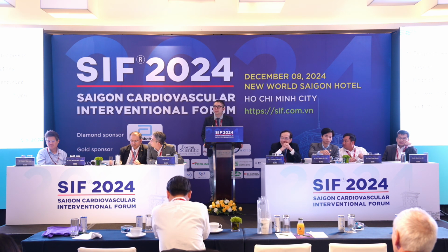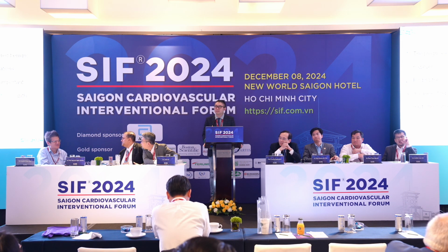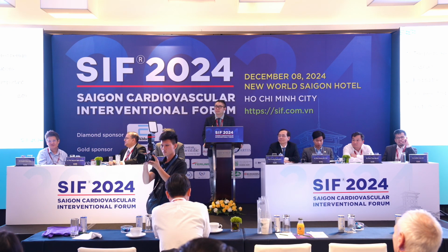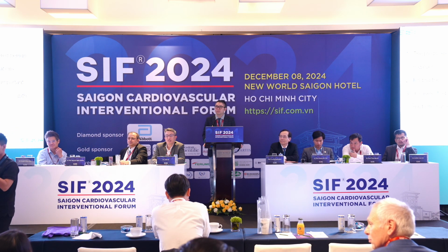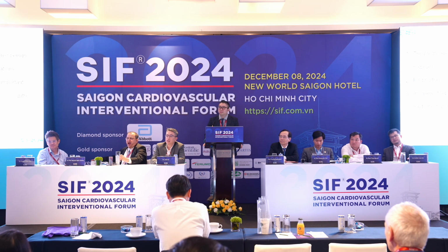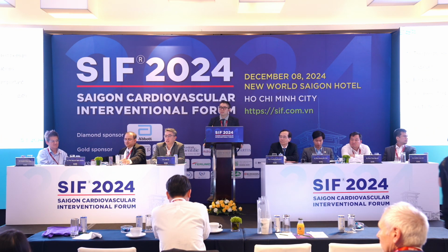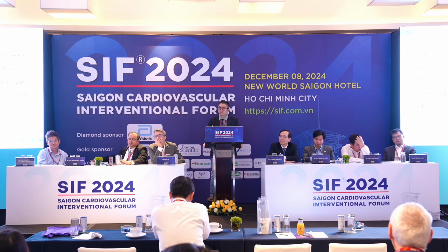I would like to congratulate you on your two very interesting cases. But for the second case, I have a comment: because the patient had a cardiac arrest, you have to check your angiogram again. Without any reason, you have to check the angiogram. I think you can check for two reasons. You should check whether any artery perforation is still there or not. And what about the thrombus, after you had very slow flow after the case? I think the patient is quite lucky. He overcame the cardiac arrest. But I think there is a chance when we check the coronary angiogram again after the cardiac arrest.